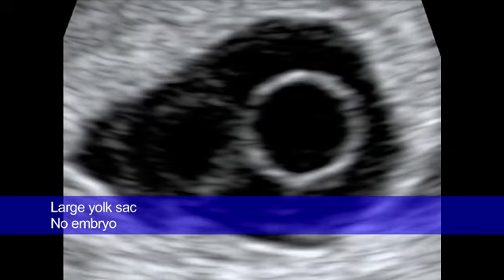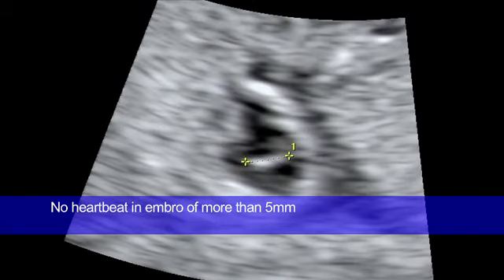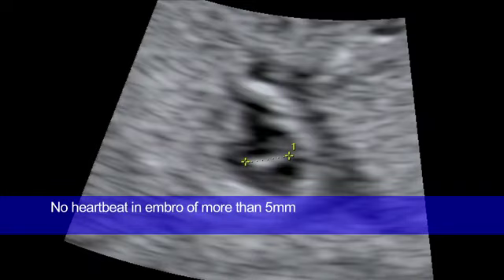On occasion we see no embryo, but we see a very large yolk sac, as shown in this slide. And in the situation where an embryo is visible, the absence of a heartbeat in an embryo measuring more than 5 millimeters is also strongly indicative of early fetal demise or missed miscarriage.